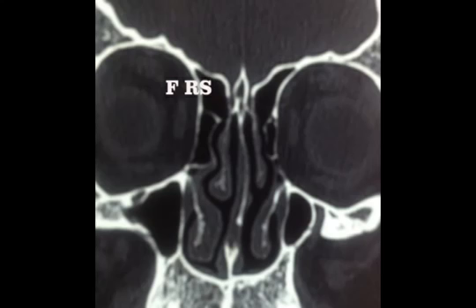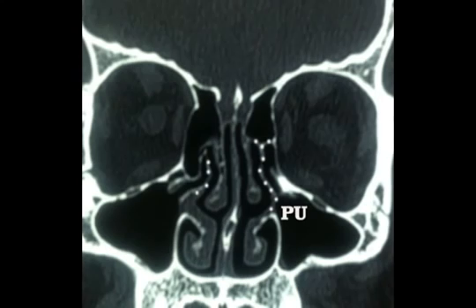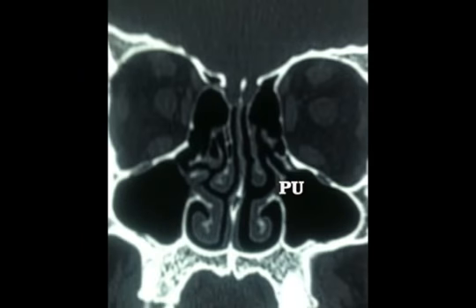It's not the frontal sinus because the M sign is missing. This is the natural ostium of the maxillary sinus. On the left side you can see the uncinate process very clearly going towards the lamina papyracea, and that's marked in the white dots, and the inferior and the middle turbinates.